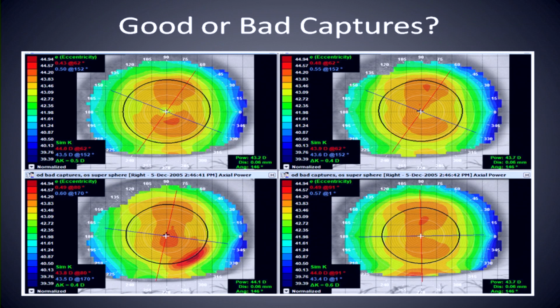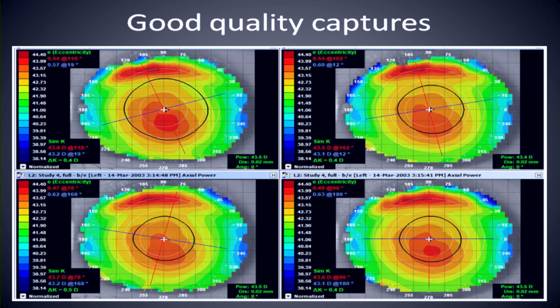If we had multiple maps that showed that flatter area in the same spot, then we can presume it's the real shape of the eye. What do you think this is down here? Notice how it's not really on that image. It's not as steep or as curved. That may be tear film wedging up, and that's a good reason to have the patient pull their cheek down when you're imaging, just to get any tear film wedging, especially if you put in artificial tear. Now we've really loaded up the eye with fluid.